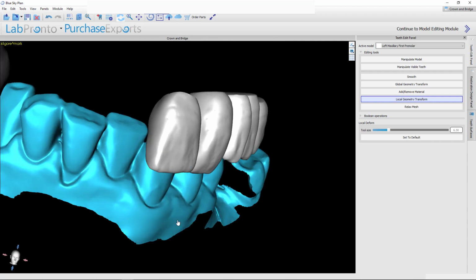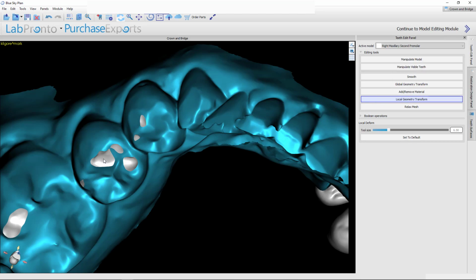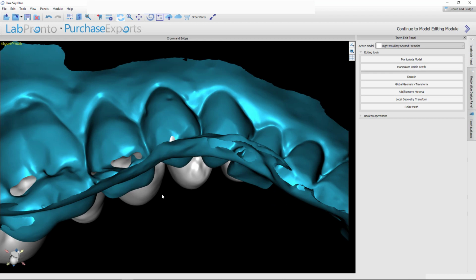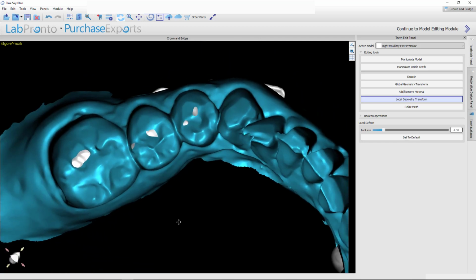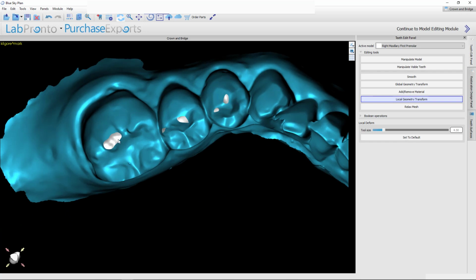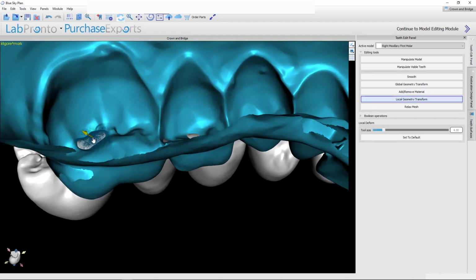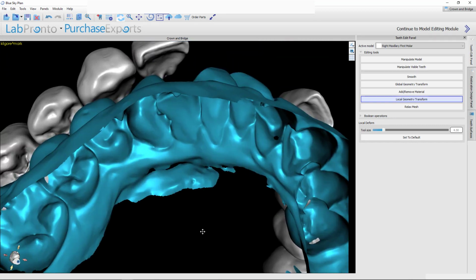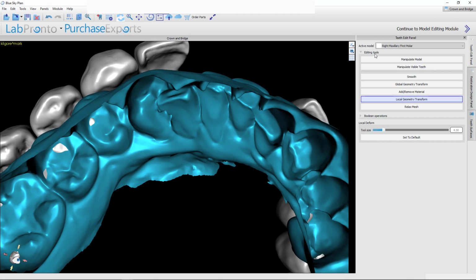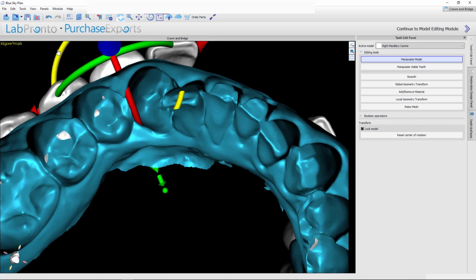All right. Where else needed significant adjustment? All right. So how about this tooth? There we go. All right. So my occlusion is mostly dialed in. And then I think for that canine, honestly, I could probably accomplish it just by a slight rotation. So get that where I can see it, and then I give it a slight twist, and now it's resolved.